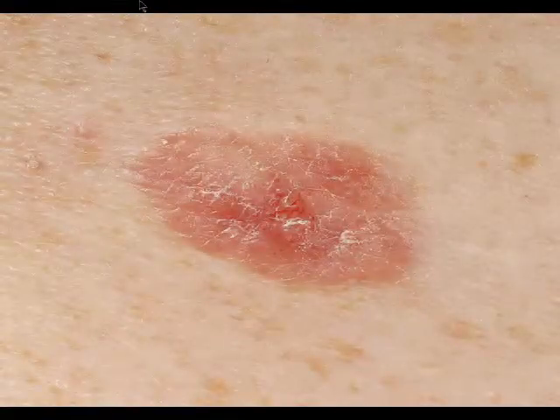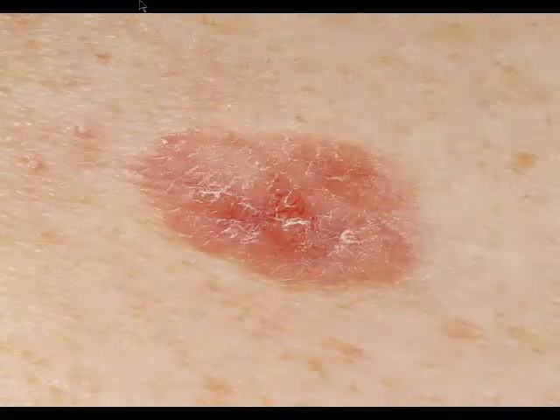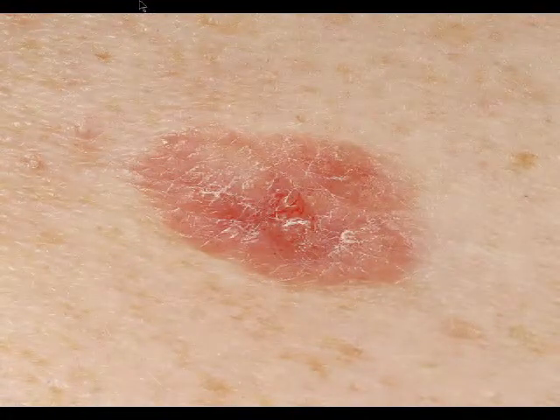This is another slightly elevated plaque, unpigmented. Which type of vessels do we see? Well, we see a polymorphous vascular pattern, dotted vessels, coiled vessels, and linear serpentine vessels. What is important is if in a flat lesion a polymorphous vascular pattern consists of dotted vessels plus other vessel types, you should think about melanoma, even in the presence of gray clots. Gray clots can be found in basal cell carcinoma, but also in melanoma.